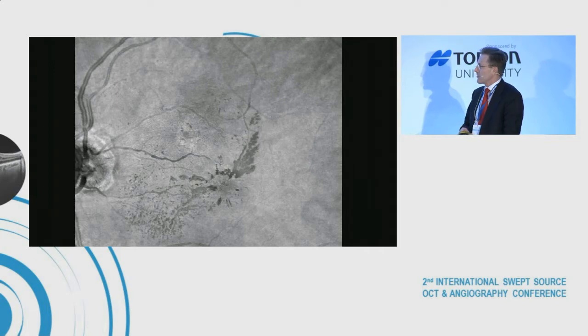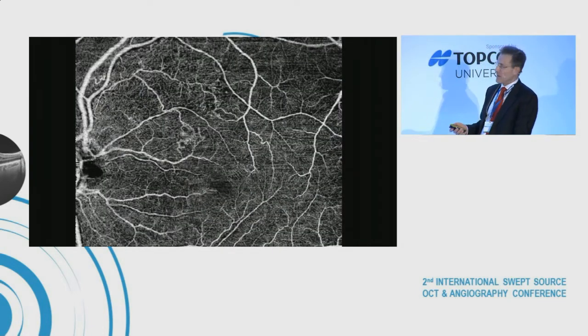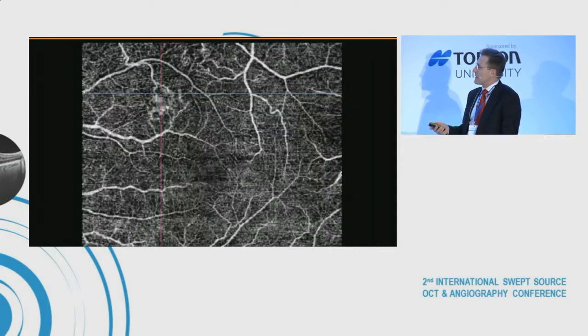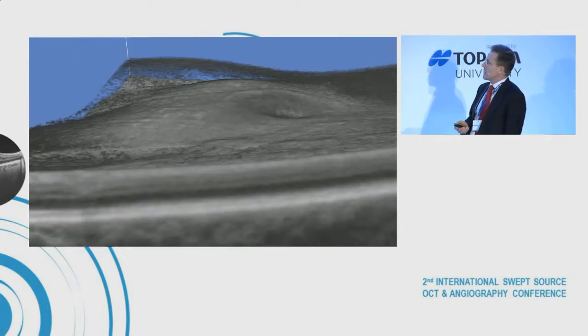Here's a branch retinal vein occlusion case, and you're all looking for the occluded vein. It's a bit superior and nasal to the fovea, where we have hard exudate. And if you do an OCT angiogram, you can see that there is a coil of distorted vessels right at the spot where you can figure out that the exudation is coming from. And here it's in the crosshairs. And now let's see it from outside before we creep into the cave.